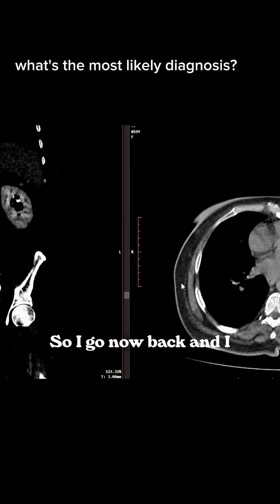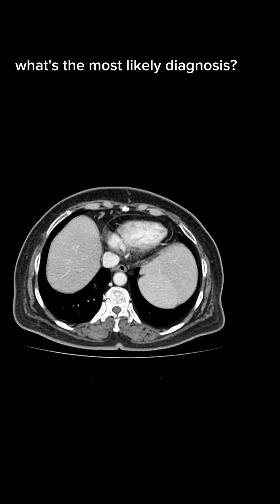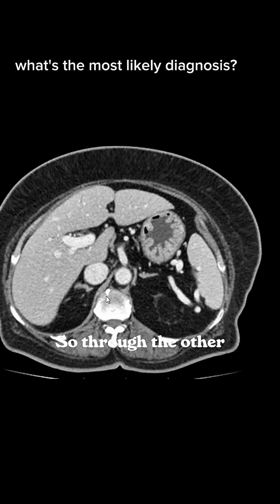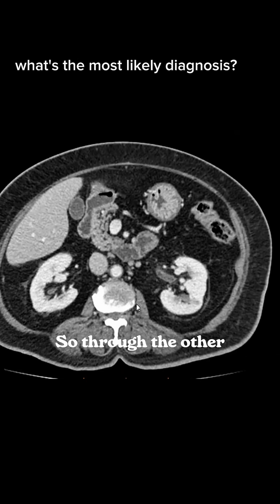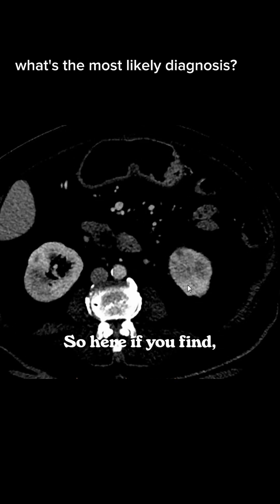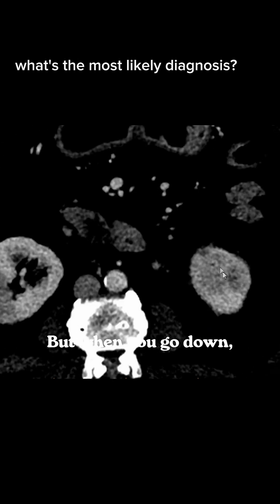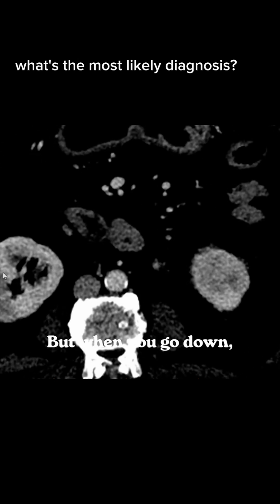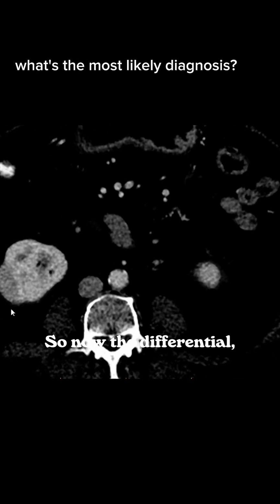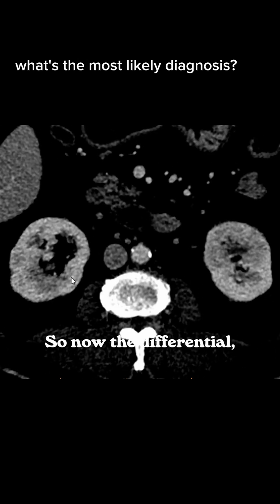So I go now back and I will show you in the images, is it true or not. Through the other phases I would try to show you, is it true or not. So here you'll find that the renal parenchyma is fine, but when you go down you'll find that there is something different, and here as well. So now there is a differential, we have to think about what it could be.